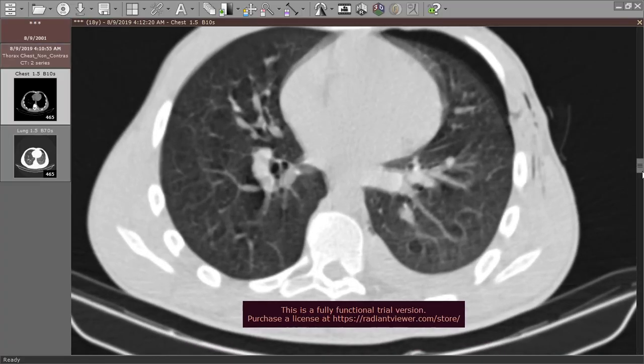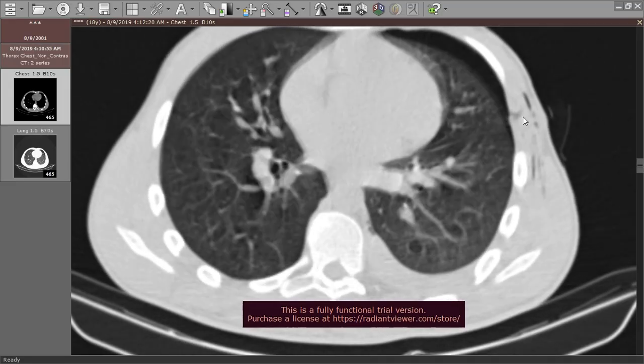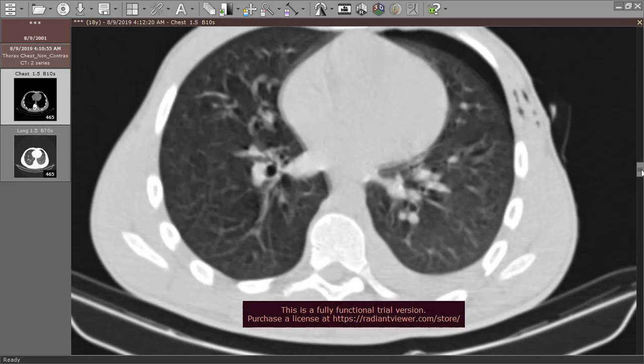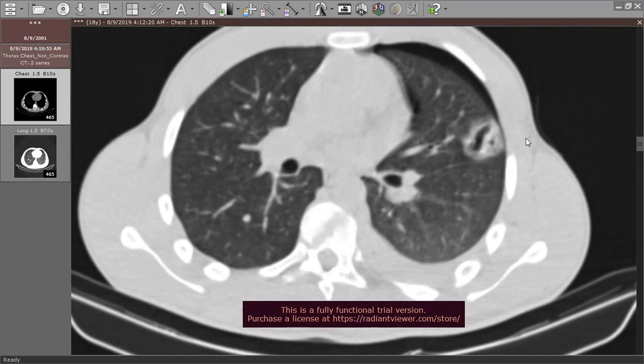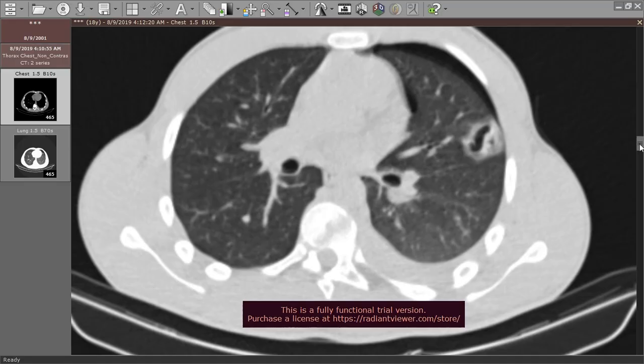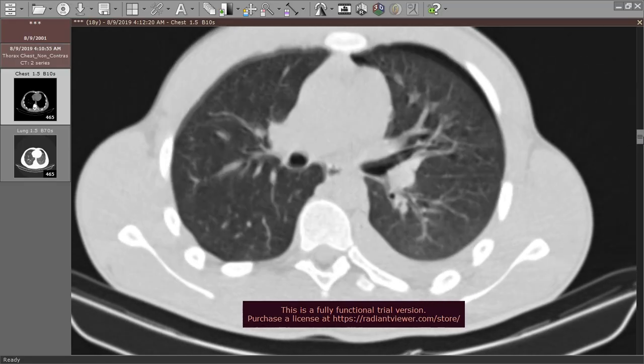Can you see this track? It is mostly the site of leakage, the site of stab. Also we have a cavity here, like a hematoma with lung laceration, sequel to the trauma, to the direct injury of the lung.